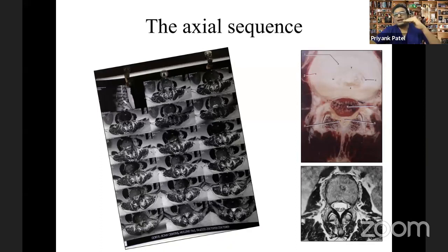And again, the cuts are made at specific areas. One cut goes through the middle of the body, one cut goes through the disc space and the facet joint, and one cut goes through the pedicle. So usually you have three cuts done at every level. And to make life easier, they also label it. If you are smart, you can just read the labels. For example, you see here it is mentioned L3, which means that this is an actual cut at the level of the L3 body.